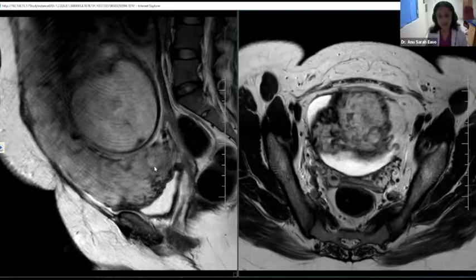Yes, so the placentation is abnormal, and definitely there is a placenta percreta, and even the margin with the bladder is appearing ill-defined. There are multiple flow voids, multiple T2 dark hypointense bands within the placenta. So all these are pointing towards the diagnosis of a placenta percreta.